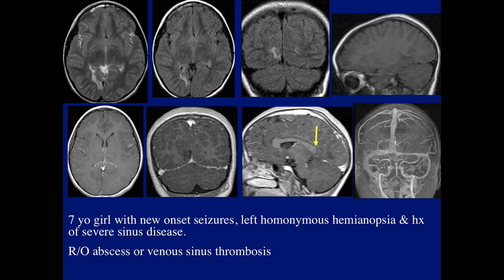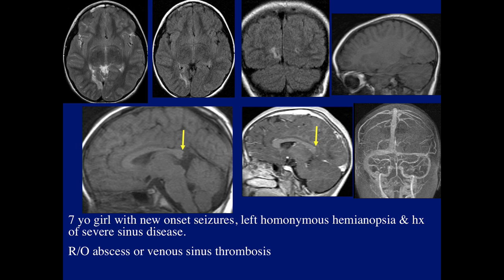Here's the finding. What is the arrow pointing to? Correct. As Dan says, the arrow is pointing to the splenium. The splenium does not look normal. And the significance of this abnormality I will get into now. Again, even more noticeable on the pre-contrast scan with an enlarged image.